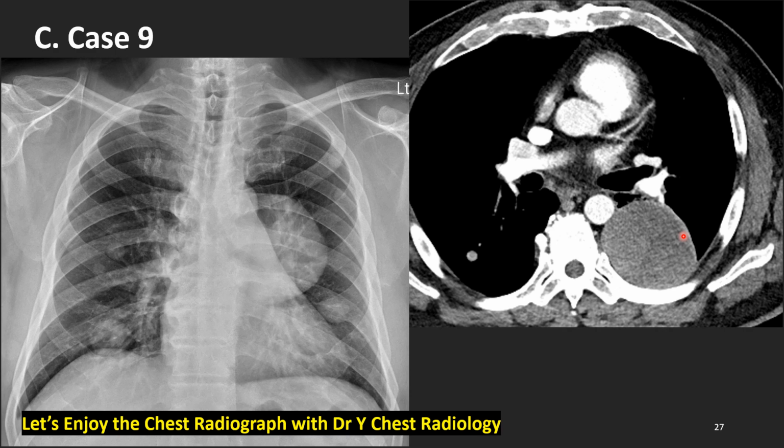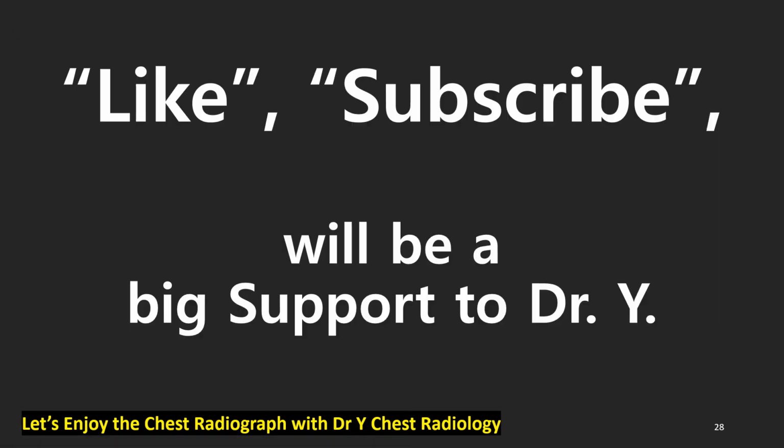But there are so many other variable-sized lung nodules here at the same time from the beginning of hematogenous metastasis. Just the largest one of the hematogenous metastases looks like a paravertebral compartment neurogenic tumor. This is lung metastasis.